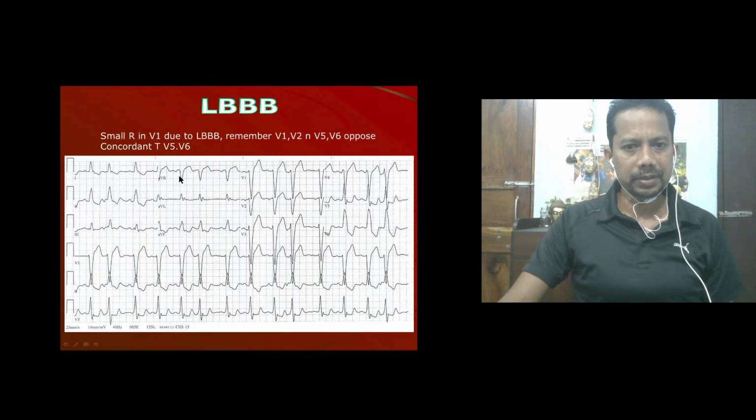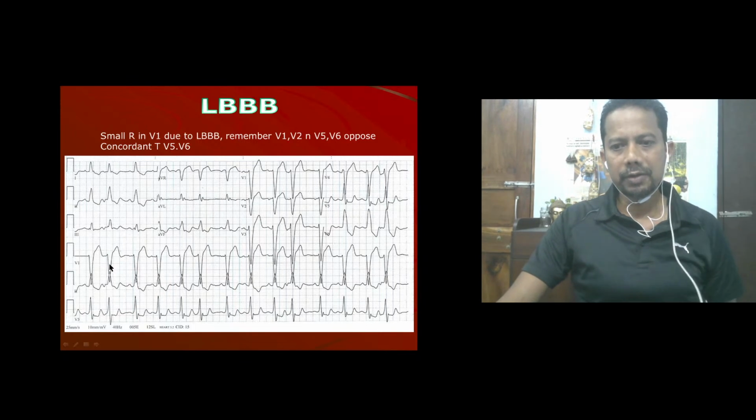There are a lot of ectopics. This is an ectopic, there is no P wave. This is an ectopic, premature ventricular contraction, there is no P wave. Okay. And it should have occurred out here, it has occurred prematurely. So, we will call it VPC.